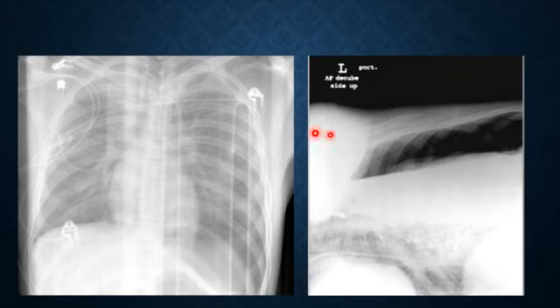And when the patient is supine and they take the X-ray, this fluid was flat posterior to the lung. That caused the diffuse increased density of the lung. This is called the veil sign. It's like someone is wearing a shawl on his hemithorax. Okay, this is another sign.